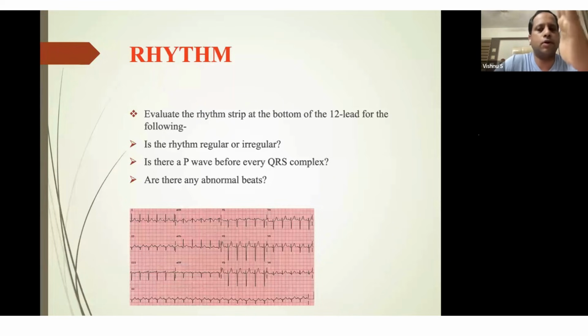P should be always followed by QRS. That is the rhythm. Rhythm can be regular or irregular. The presence of P wave just before the QRS tells the rhythm. Usually in the clinical context നമ്മൾ നോക്കുമ്പോൾ ഒരു സ്ട്രോക്ക് ഉള്ള പേഷ്യന്റിന് rhythm abnormality usually we are expecting atrial fibrillation. അതല്ലാതെ ഒരു പേഷ്യന്റ് ടാക്കിക്കാർഡിയ പറയുകയാണെങ്കിൽ SVT ആവാം.